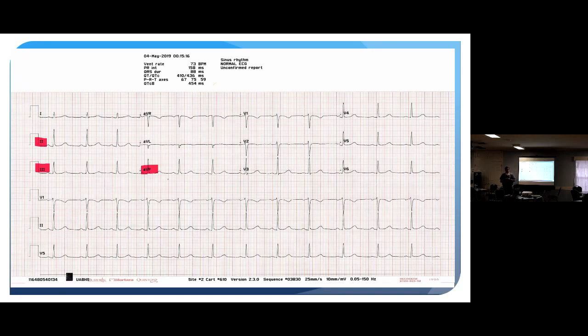I manage the patient. I start moving toward a hospital that can take care of this guy either by cath lab or thrombolytics. Next place I look is V1 through V4. So elevation in any of these is very concerning for a STEMI. And then if you look at the V2, V3, and V4, you got ST depression, T-wave inversion, that's a posterior. Remember, V1 through V4 is the front part of the heart. So if you're depressed, it's the back part of the heart, right?